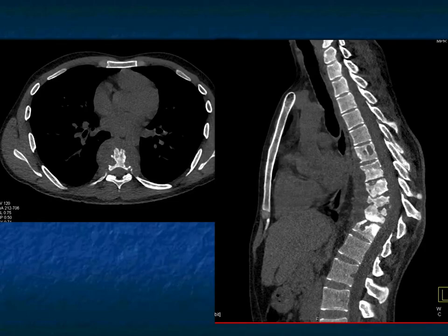This patient presented with back pain, and when you look at the axial images alone, you see a paraspinal mass. So I'm thinking about lymphoma and maybe infiltration of the spine. What else gives you paraspinal masses? Neurogenic tumors, but it's not low density. Even though this is a non-contrast scan, it's not the typical low density of neurogenic tumors. So adenopathy, maybe it was a patient with esophageal cancer. Maybe it's lymphoma. Other things, extramedullary hematopoiesis, that's a thought.